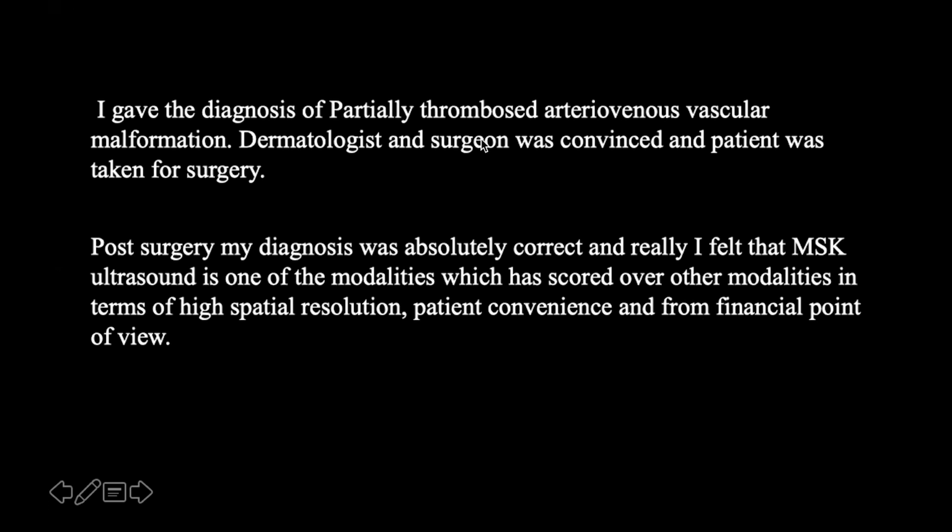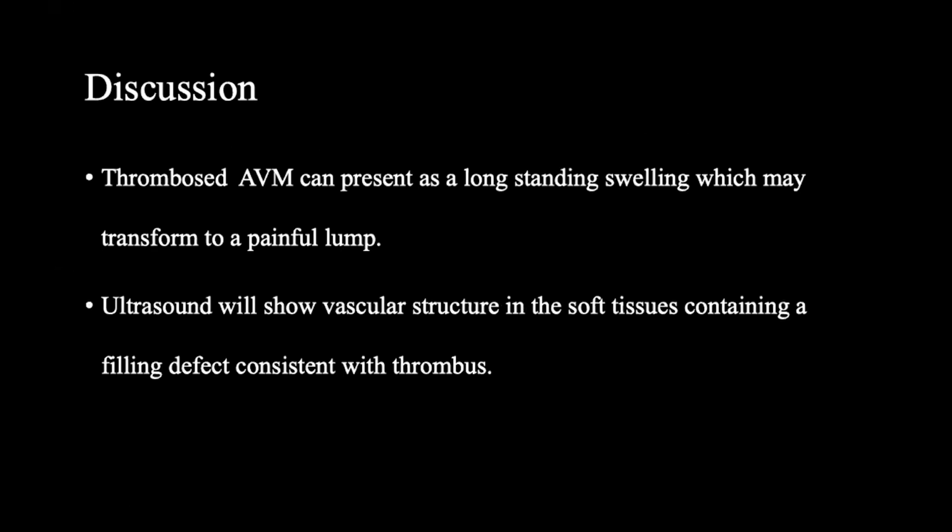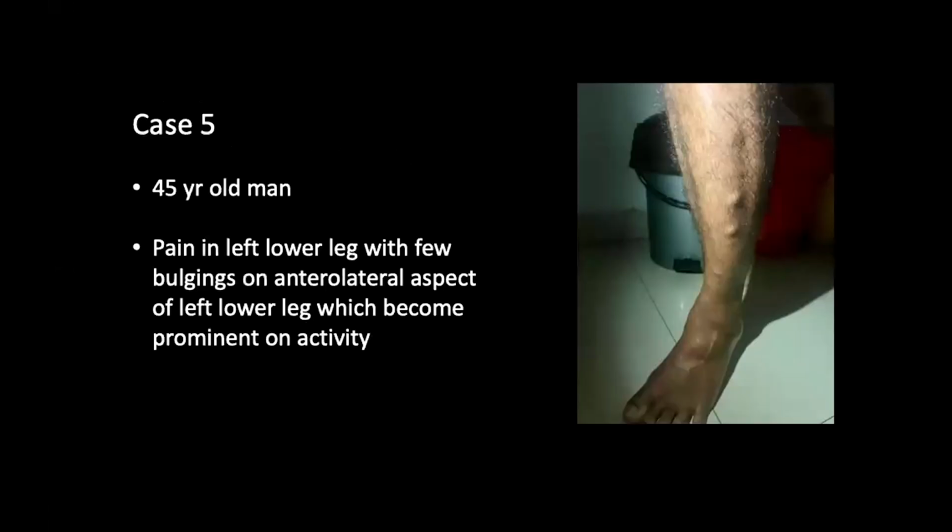The surgeon was convinced and the patient was taken for surgery. Post-surgery, the diagnosis was correct. So here I felt that ultrasound really scored over other modalities in terms of high spatial resolution, patient convenience, and less cost. So thrombosed AVM can present as a long-standing swelling and can transform into a painful lump. Important is it is vascular and there can be a filling defect or a thrombus.